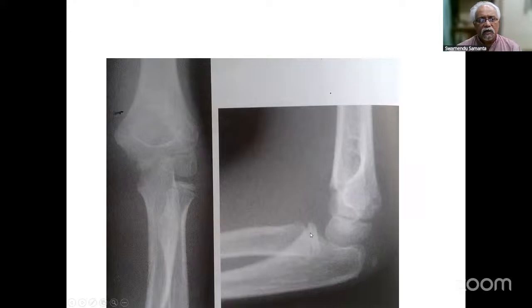Okay. So now I am coming to this radiograph. Now we'll go very quickly. Probably we have understood from these six or seven X-ray radiographs how we are going to present. Anybody please volunteer, what are you seeing here?